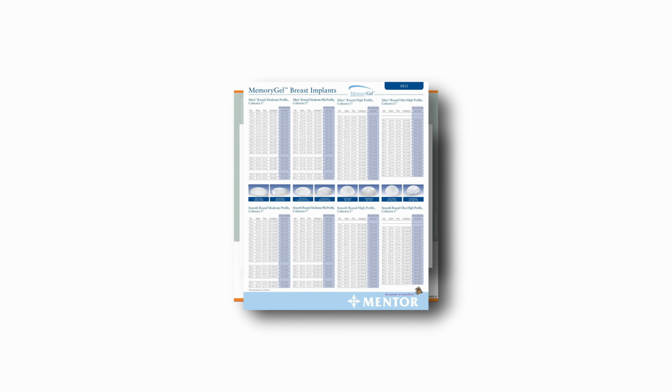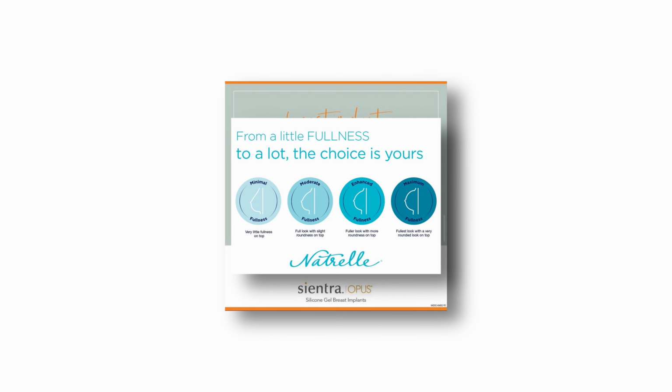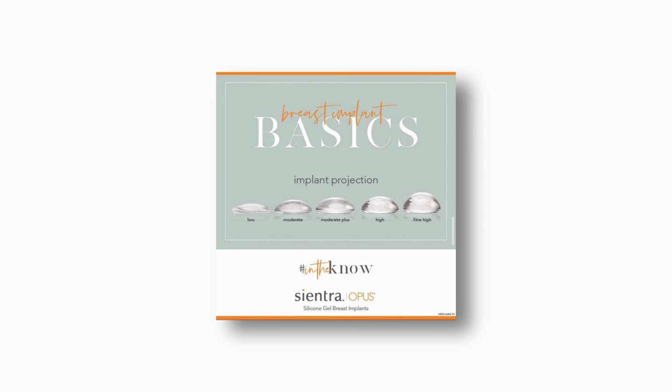What does profile actually mean? Depending on whichever brand of implant you're looking at, you're going to see that they have multiple profiles, and from brand to brand, those profiles are named differently. What I have with me here are Allergan Natrelle implants. For the sake of this video, we're going to focus on that, although I'm sure I'll pepper in a couple other names to hopefully not confuse you, but give you a little clarity.